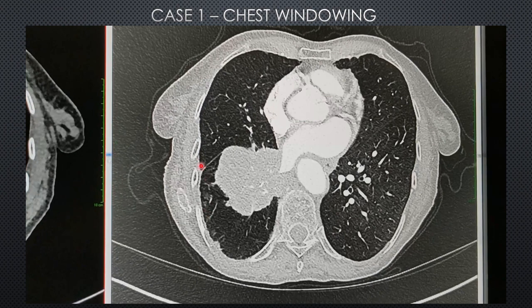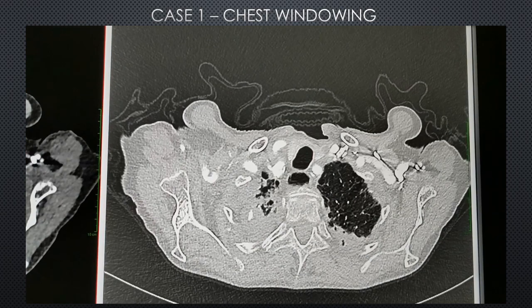This here is your oblique fissure, and this side of the lung, aside from the emphysematous changes, seems otherwise clear. These are your ribs here, and I can't see any fractures, no suspicious lesions in there. And if we follow these vessels for identifying a PE, there was no PE on this image.